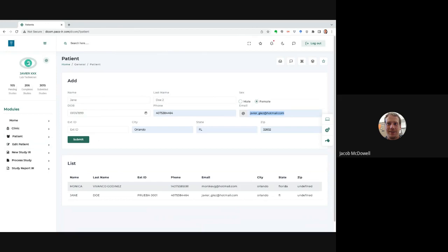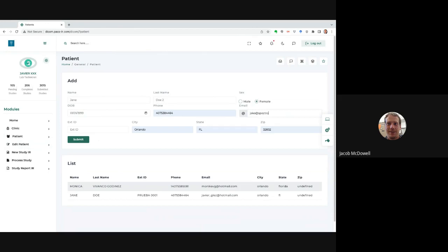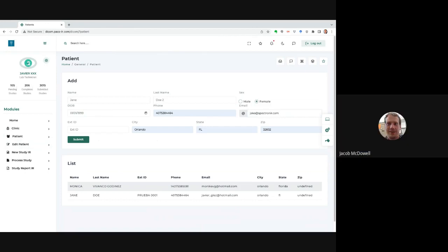Okay, so I guess the way this works right now is that the users of this software would look at the images, and after they interpret them, they would send that finding and store it on DICOM. Exactly. And so anybody in the world could pull that Jane Doe's file from DICOM and look at the findings, right? Yes, that's correct. The report, images, findings, text, everything would be stored on DICOM.